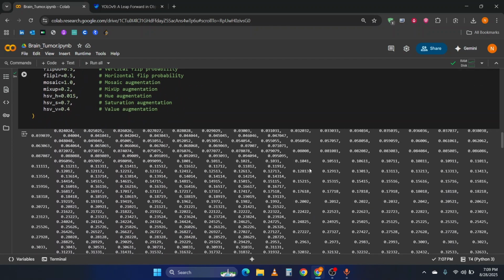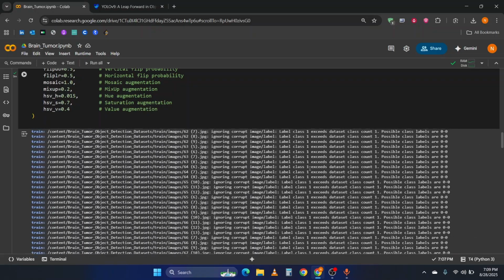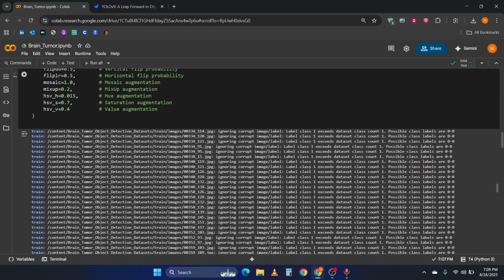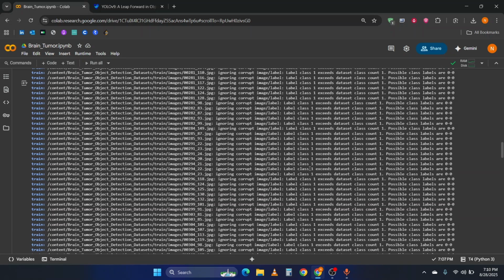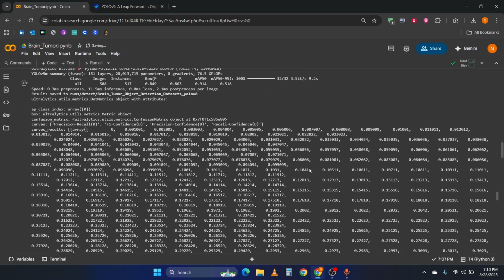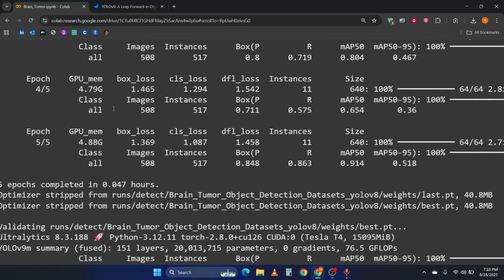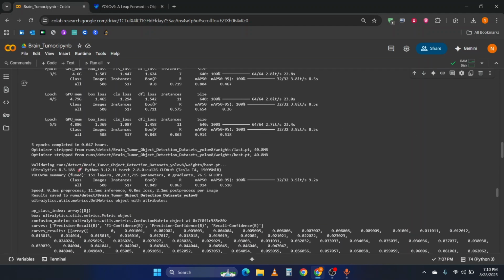You can see, training got completed. We have all 508 images, and 64 batches. These are the losses.